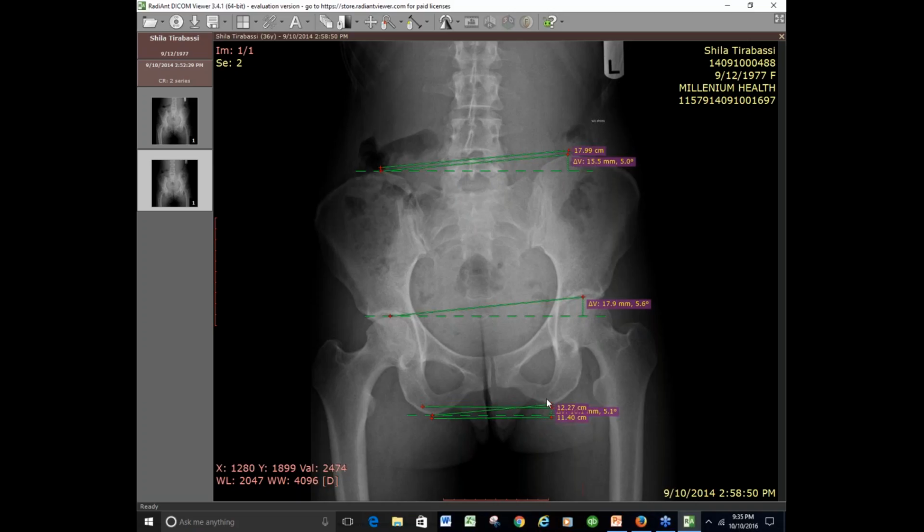So there's a calculation that has to be done that says if I increase this to 17 millimeters, because you got to get an angle, right? You got to get an angle measurement. And angle is measured by how far you move along the x-axis and how far you move along the y-axis, right? That 5.1 degrees comes from that. And there is a calculation for that. I'll have to remember exactly what it is, but you can measure that. You can even take your goniometer and measure that, right? If you measure this angle, right?